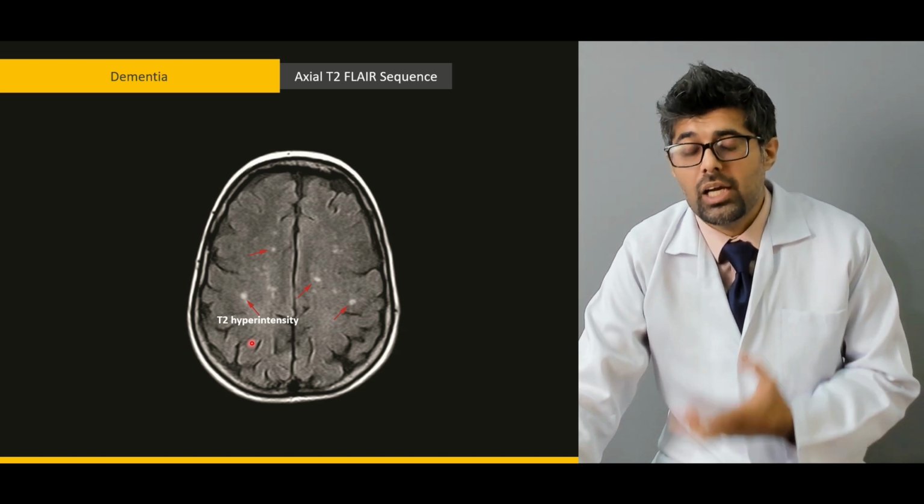And dementia, along with Alzheimer's disease, can occur through these bright objects, but there are also other kinds of dementia, like angiopathic dementia or multi-infarct dementia. So we will see them further down the slides. So these are the T2 weighted hyperintensities, which are usually termed as unidentified bright objects. And these are the hallmark or the pathognomonic of dementia and Alzheimer's disease.